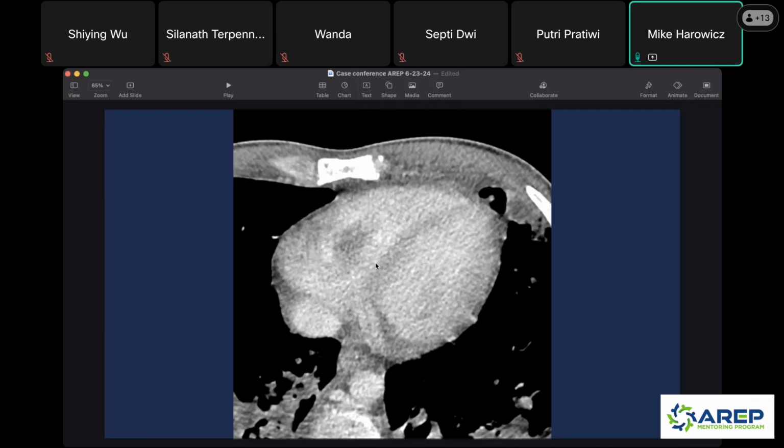We know there's septic emboli, we nailed that diagnosis. Now, can we point out where the problem is at? And it's right there. And so all of these are just shooting off through the pulmonary arteries. That infected material is going out and getting lodged into those distal vessels, those distal pulmonary arteries, and you're getting those cavitary consolidations because of that.